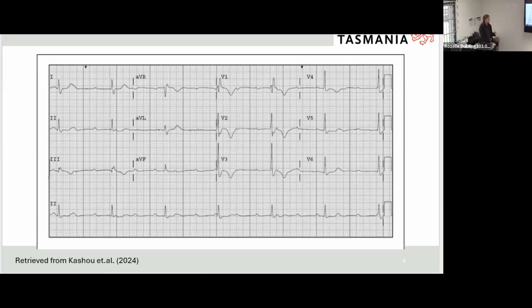It's just that in particular, this particular pattern we're recognizing is potentially an AV block because we're seeing that P waves are independently having their pattern, and the QRSs are narrow and having their independent pattern.